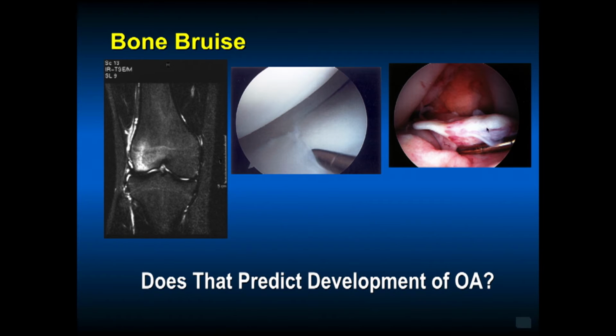And this is what the mop-end tear of the anterior cruciate ligament looks like. And this is what our notch looks like. So on the x-rays that we showed, the notch view, this is what we're looking at with the notch. So the ACL should be connected here. And if you have a small ACL, then you have a small notch.